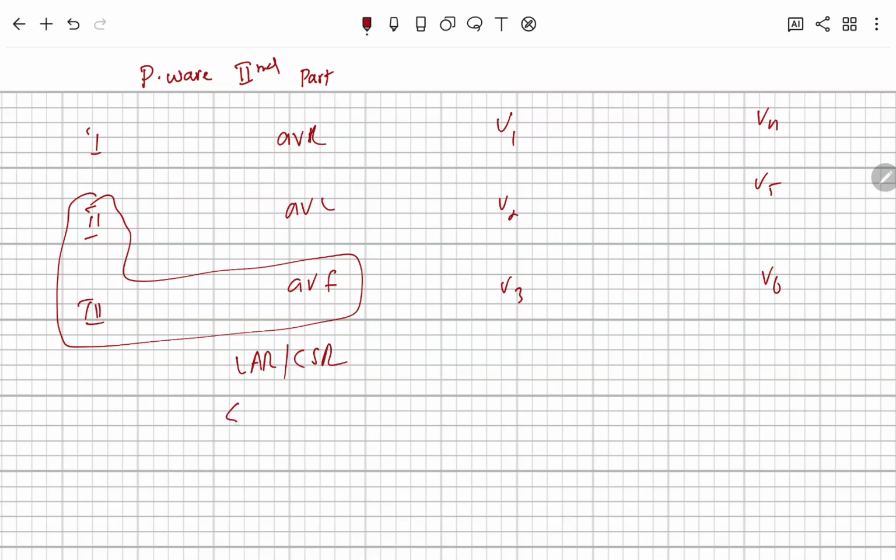If the PR interval is less than 120 milliseconds, we're gonna call it AV junctional rhythm. If we find inverted P waves, we have two differentials. If we find inverted P waves in lead V1 and lead 1, what could be the possibility? We will have to check the QRS complex along with that. If we check the P wave, it is inverted, and along with that the QRS complex is also inverted.